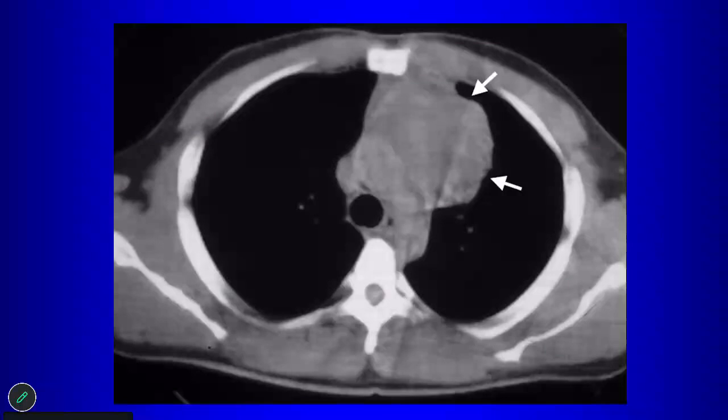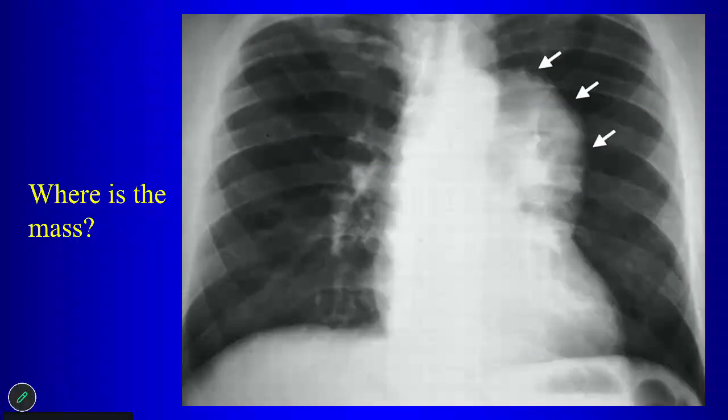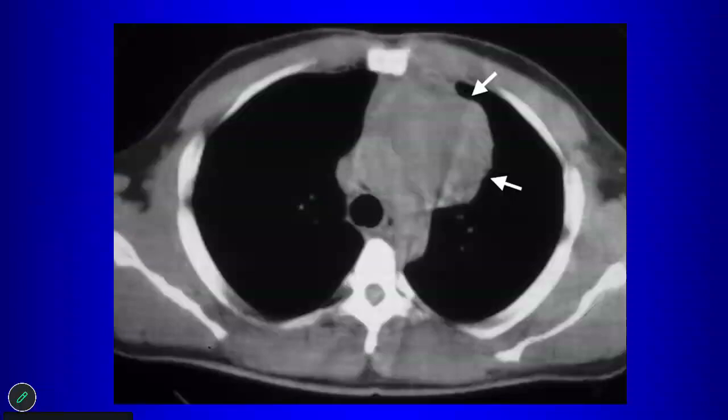Teratoma. Well, you want to go through the 4 T's, go through them. Okay, thyroid. Wait, hold on. Are you going to say thyroid for this? You're not going to say thyroid for this. Why? It's too far down. Yeah, it doesn't extend up into the neck. So we don't like thyroid for this. So what are we left with? Lymphoma. Lymphoma, yes.